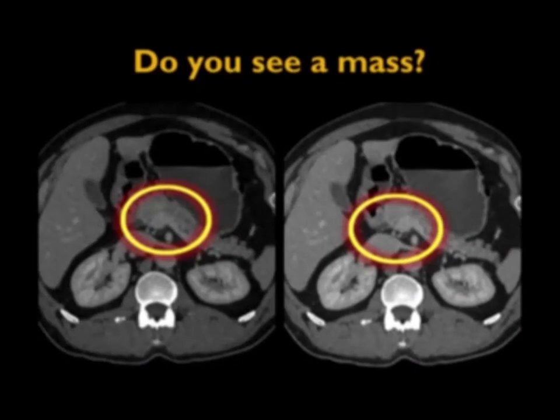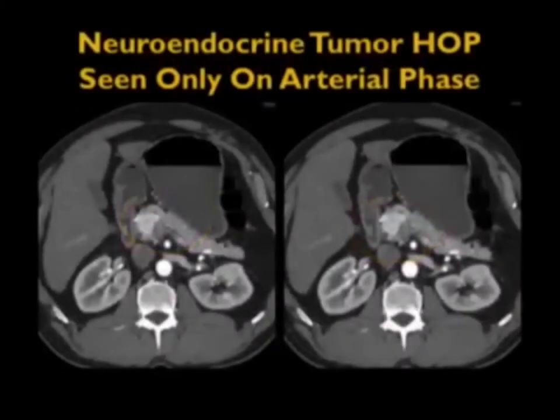Now, to make the point about the timing, let me show you this set of images and ask you to say, do you see a pancreatic mass? Well, there's no pancreatic duct dilatation. There's no common duct dilatation. Texture looks pretty good, and I'll circle the mass for you. Still hard to see. But instead of giving you this very nice 60-second or venous phase image, I'll give you the 30-second, and look at that obvious mass in the head of the pancreas. Very obvious 3-centimeter neuroendocrine tumor.